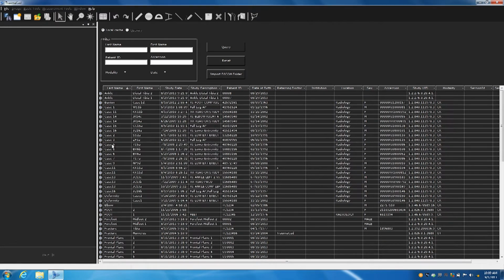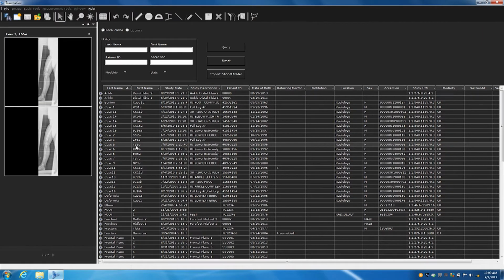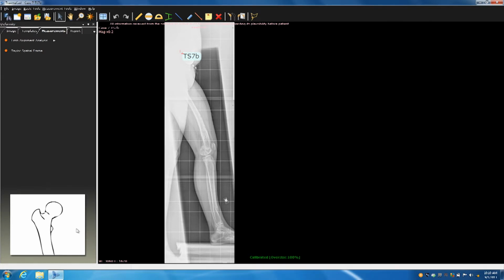So case number 5 should show us a sagittal, yes. So just select one of these, and then hit next down below the images, because some of these are preloaded, and they've already done the calibration and everything. So it's just a little bit how we loaded the cases in.